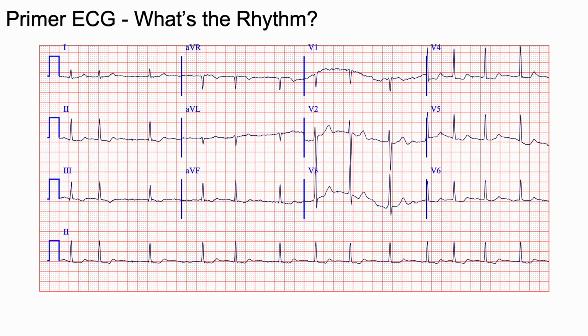So let's start again with a warm-up EKG. Take a look at this EKG and remember to try to go through systematically for rate, rhythm, axis, and convince yourself of why for each one of those pieces. Try pausing and testing yourself before moving along in the video.